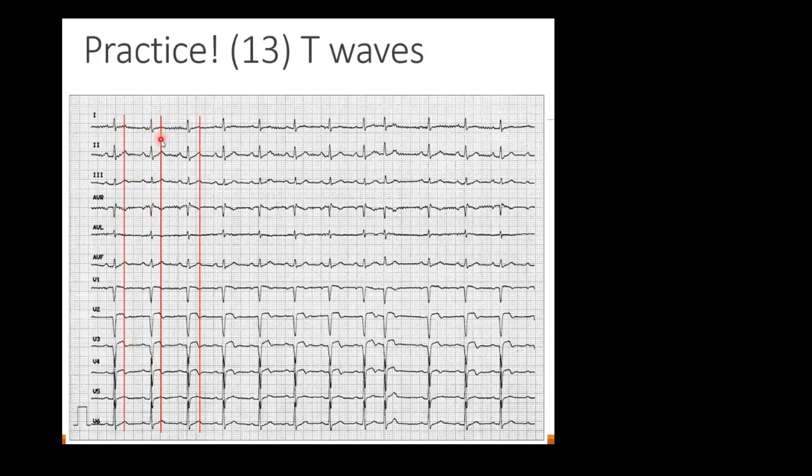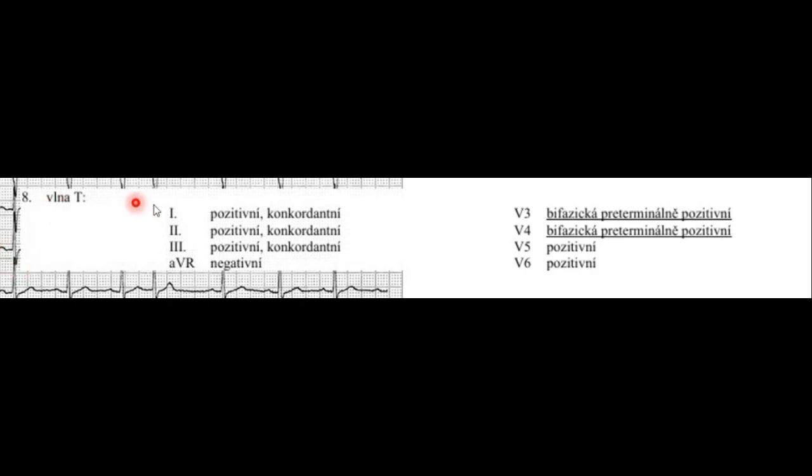So same thing applies over here. Very obvious that this is a T wave. And when you're going down here, you realize that you're going right through the middle. That means all of this here is biphasic waves. This is probably just positive, positive. So that was the answer over here. And of course, the biphasics are pathological, so you underline it, and you mention repolarization disorder in your conclusion.